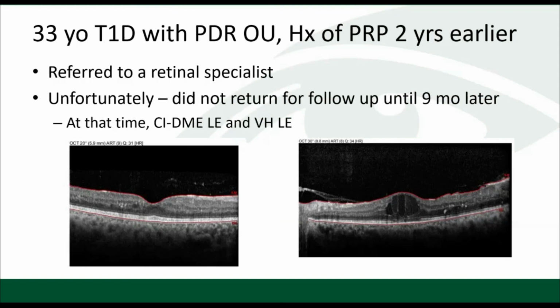Mark, I think it's a beautiful case, and I think the ability to capture some of the peripheral changes that we see in diabetic retinopathy is very key. At our big national meetings, there are several presentations where we look at either wider field OCT-A or montage OCT-A, and we're able to capture IRMA, we're able to capture NVE and NVD. And the question is, will it change the way we approach these patients?